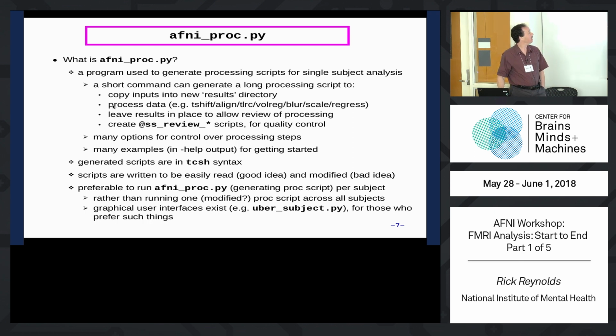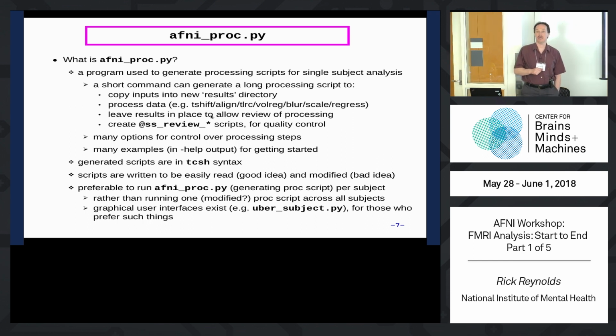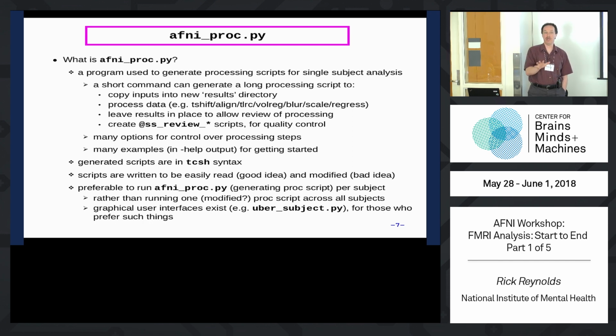And then in that directory, it will do all the processing, time shifting, align, etc. It will leave the results in place to allow for review of processing. We don't delete much of the data as we're going through. We delete some things that are just considered too trivial, but most of the data is left in there for you to have the option to review it and look, just to see if you're satisfied.